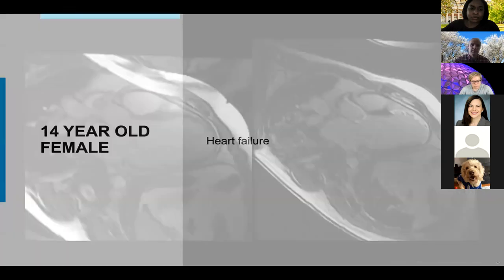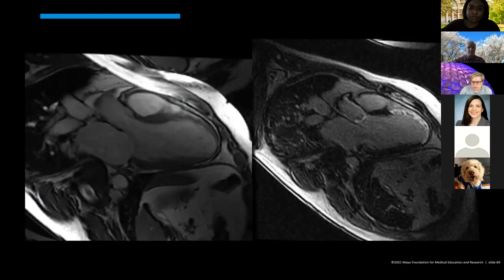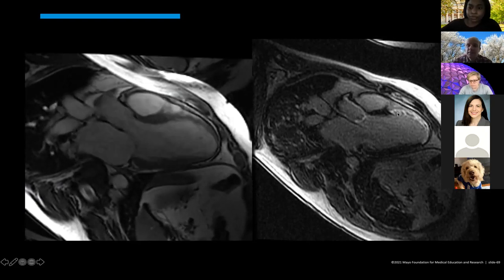Sir, with that case, there was a question in the chat. Would you call those, I think the hypoenhancing regions along the LV wall, microvascular obstruction or occlusion there? Yeah, exactly. So very nice pick up there.